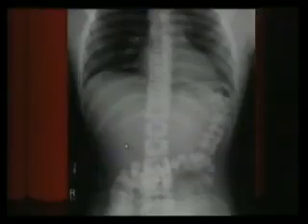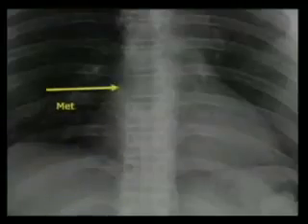But that was all off of this abdomen study. The clinicians are just looking for, is there any bowel obstruction? That's all. They're not expected to see that. Are you? Yeah, because you can get sued for missing it. You could get sued for missing a lung cancer right here. When you do a shoulder x-ray, ortho is great, but they don't really look at lungs or for pneumothoraces. They know how to look at bone. And what can cause shoulder pain? A Pancoast tumor, a pneumothorax. So we really need to be looking at everything. I know that in the ER, when you have 100 studies to read plus 50 CTs, it can be tough, but we need to do our best.